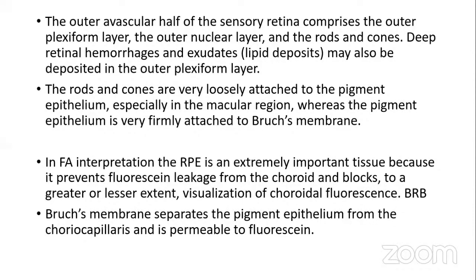So that is a sequence, it's a relay, everything happening in time and in order. Choroid first, with the cilioretinal artery if present. Then you have the artery, then the capillaries, then the vein, then the dye dilutes, and you have a repeat of the sequence, but with a lower intensity. That was what we described.